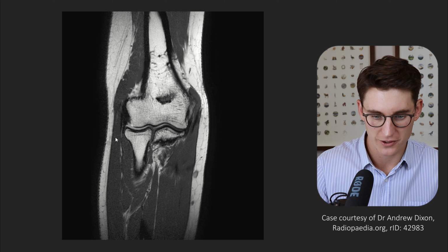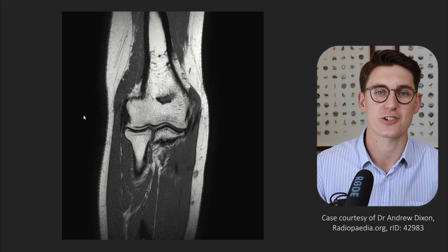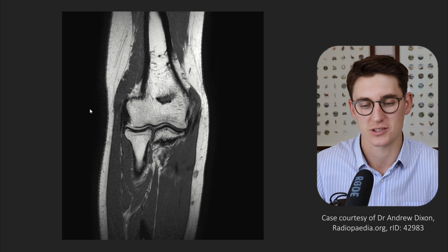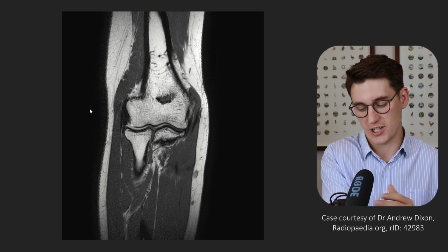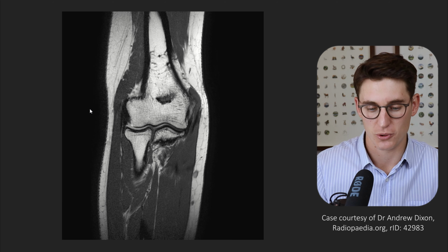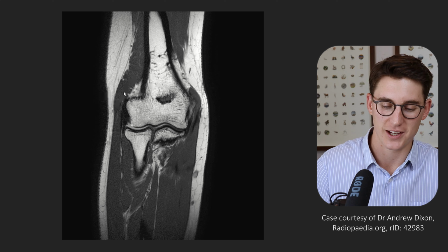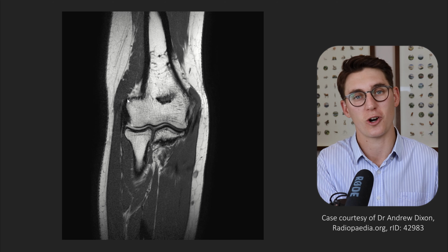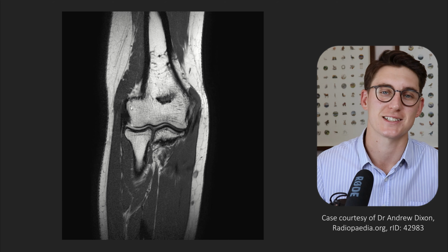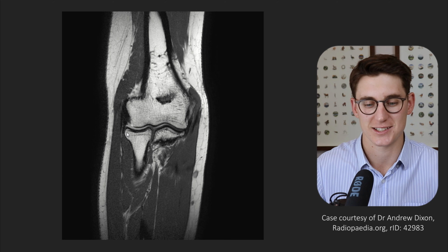As you can see, superiorly and more laterally to this, we also have other muscles that originate from slightly higher up than this lateral epicondyle, and that's what's called the radial portion of our posterior forearm muscles. That's where our brachioradialis originates, which allows for some flexion of the elbow as well. It inserts into the styloid process of the radius here distally. Our brachioradialis originates higher up there, and it's at that point as well where our extensor carpi radialis, longus and brevis also originate. They don't actually come from this common extensor tendon. So that's our lateral portion. The main tendon here is our common extensor tendon.